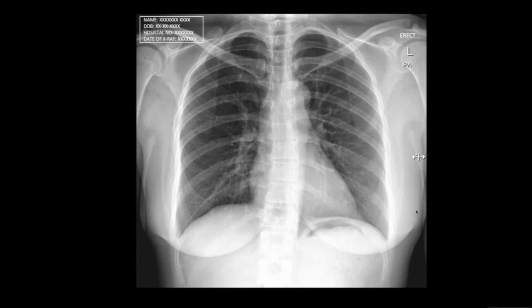Systematic approach of chest radiograph interpretation. Now check the patient's details, including name and date of birth. These may sound pedantic, but it is very crucial to avoid reading the radiographic image of a wrong patient. Noting the age is also important, as we know that certain diseases are more common in certain age groups.